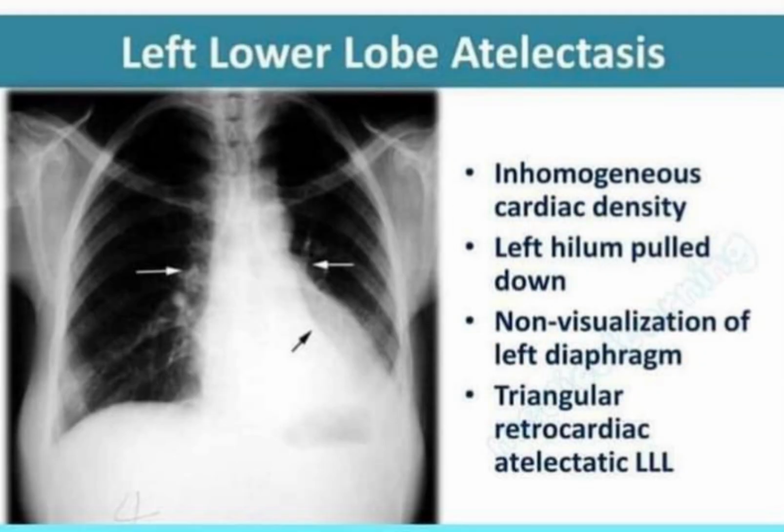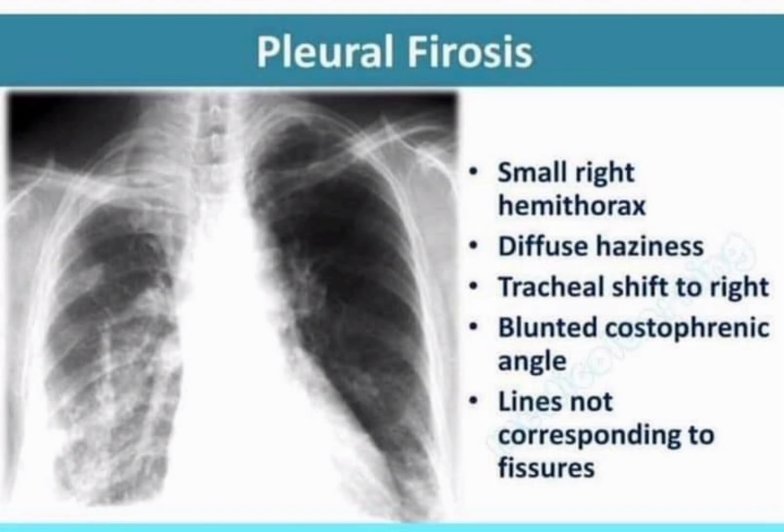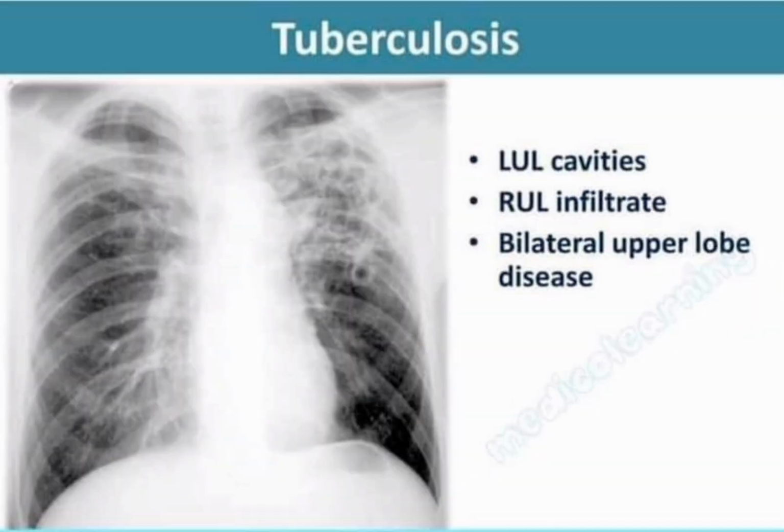A chest X-ray can reveal many things inside your body, including the condition of your lungs. Chest X-rays can detect cancer, infection or air collecting in the space around a lung, which can cause the lung to collapse. They can also show ongoing lung conditions, such as emphysema or cystic fibrosis, as well as complications related to these conditions. Heart-related lung problems.